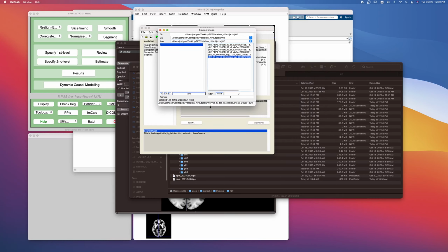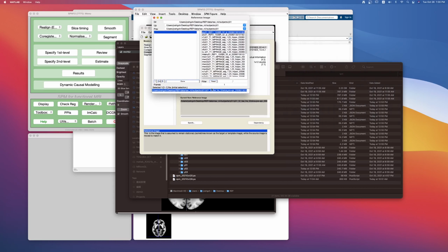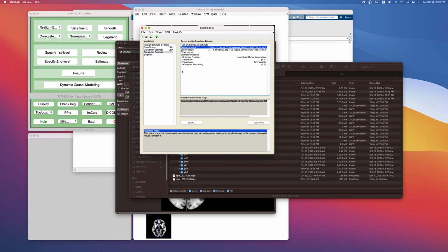So we're going to have to do this manual selection, and it's not hard at all. We just have to deselect YO1's T2, and then replace it with YO2's T2. And that's there. Then go on to the next one, where we're going to use YO2's T2, which is the same file, remember, all right? But it's now being co-registered, so it's not going to be renamed. It's going to be the same name, okay? But because we applied it after the first co-registration step, this time it's going to be co-registered to the EPI.